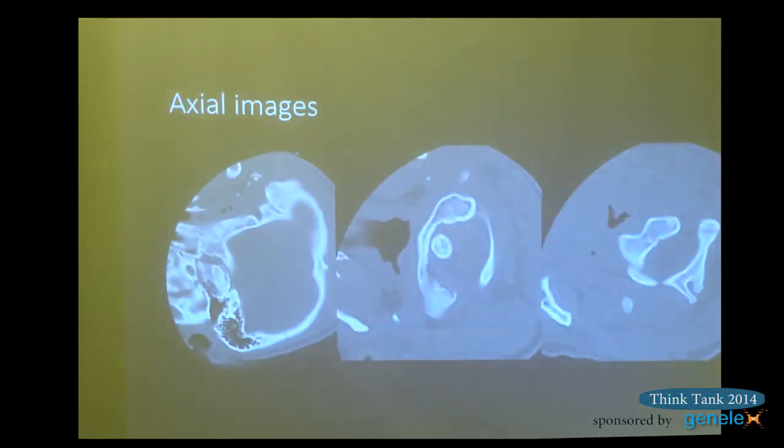And these are 3 images. This is the skull base, a little bit above the foramen magnum. This is C1, this is a complete ring. And this is C2, at which point I would measure from most likely. This is the odontoid. It arises from here.